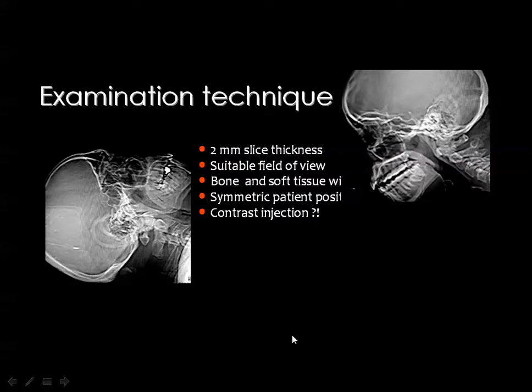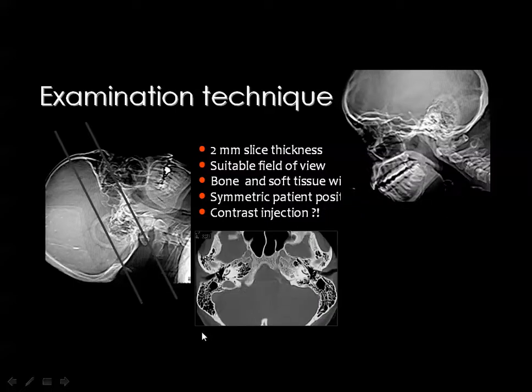Then, in order to examine the Petrous bone by CT, we have the axial and the coronal planes. In the axial images, the patient lies in the supine position. We should have a lateral scanogram, and we specify the scanning area, which will cover the region of the two Petrous bones, which are superimposed on each other in this lateral view. This is the site of the Petrous bone. We start from the base and proceed upward until we finish with the Petrous bones.